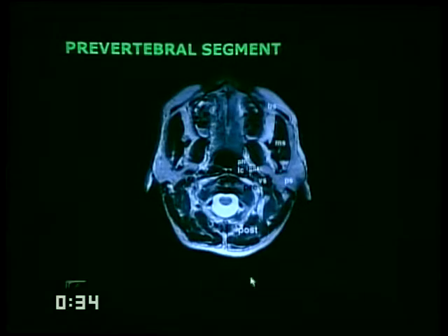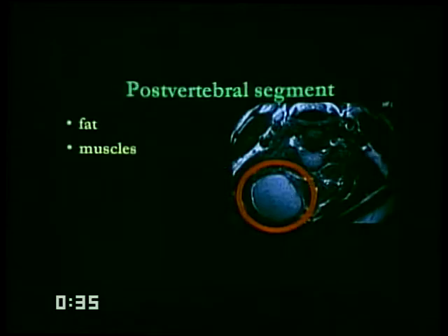Be that as it may, the importance is anything that effaces the longus muscle posteriorly belongs to the retropharyngeal space. Anything that displaces the longus muscle out and anterolaterally belongs to the prevertebral space. And that gives you an idea of whether the pathology is going to be of osseous origin, displacing the longus anterolaterally, or lymphoid origin, effacing and squishing the longus muscle posteriorly.